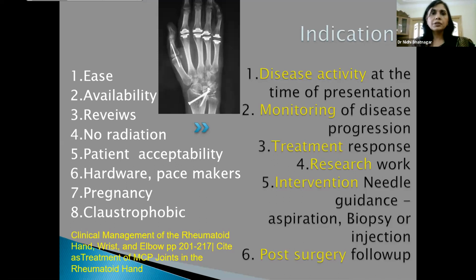And last but not least, of course, in post-surgical evaluation, as we can see here, where there are implants that have been put, and they sometimes interfere very deeply when we are doing an MRI, but in ultrasound, these rigid bioarticular implants do not interfere with the quality of imaging. And these are here at the metacarpophalangeal joint in a wrist and hand radiograph to prevent joint space collapse. So this is just an example of how ultrasound today helps enormously in the evaluation without too many artifacts that actually interfere with the imaging.